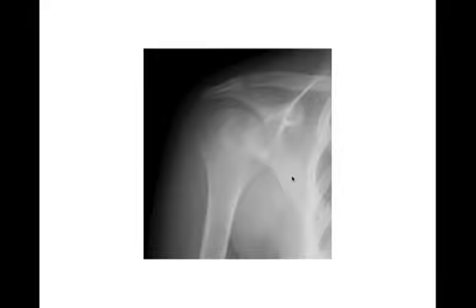First of all, it's reasonable to think of, is this a Brodie's abscess as well too? EG or Langerhans cell histiocytosis can occasionally look like this, but it's not common for them to occur in the epiphysis. But it's something to think about. But again, geographic lytic lesion, sclerotic border, epiphyseal location. This is a younger patient. Really think about chondroblastoma. So this is a nice example of a chondroblastoma.